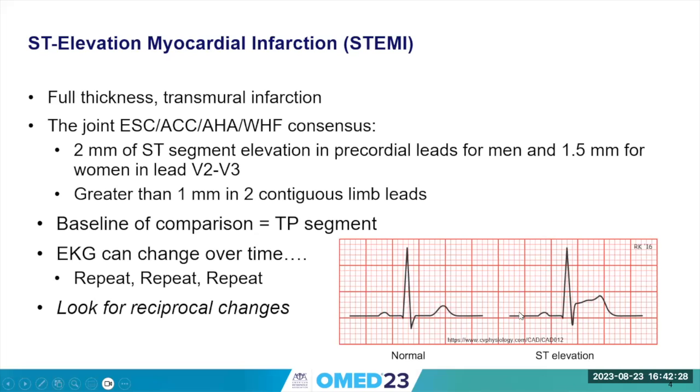You can see the very obvious ST segment elevation. One of the important things when you're handed an EKG, especially one that you're not 100% sure about or is a little bit questionable, is that in a patient that is actively undergoing some type of infarction, the EKG can change over time. So you need to repeat it. If it's questionable, if you're not 100% sure, hey, can you repeat an EKG in 5 minutes? Just have that going 1 or 2 times so you can see what's going on and see if there's any evolution.